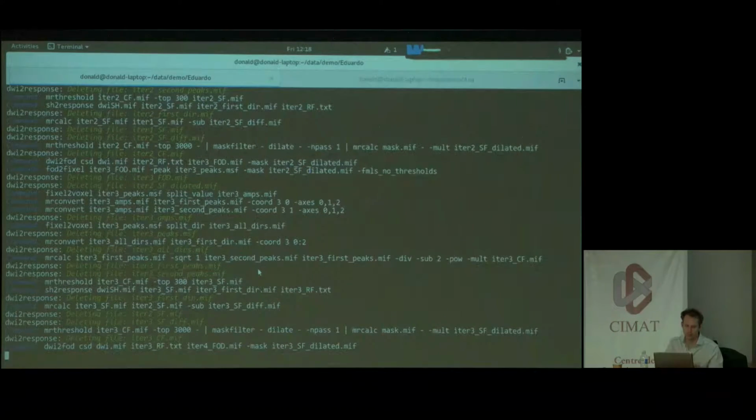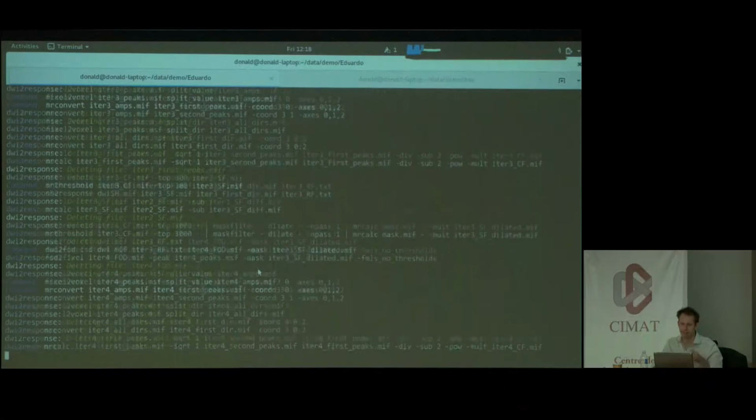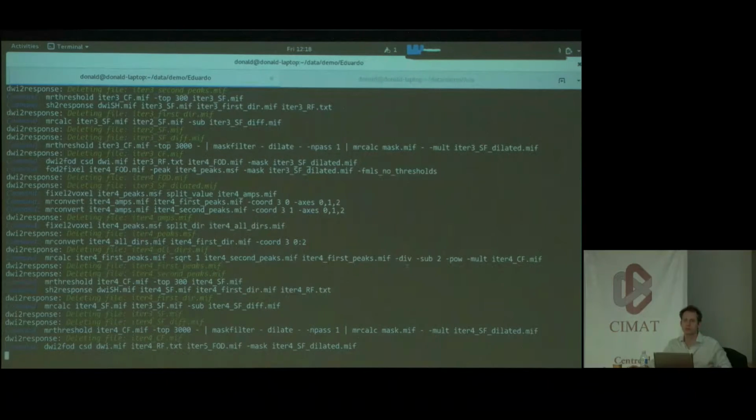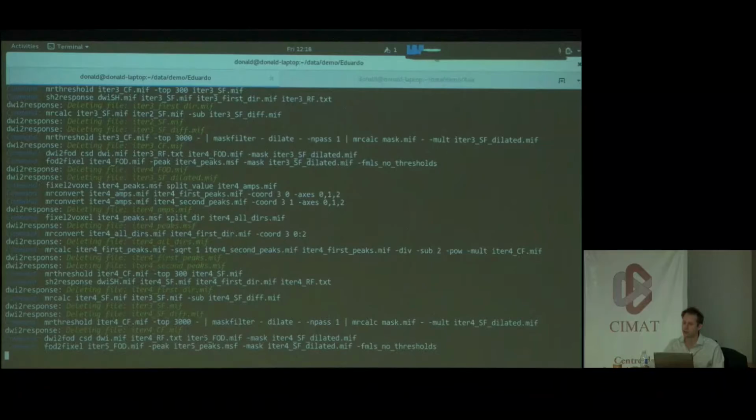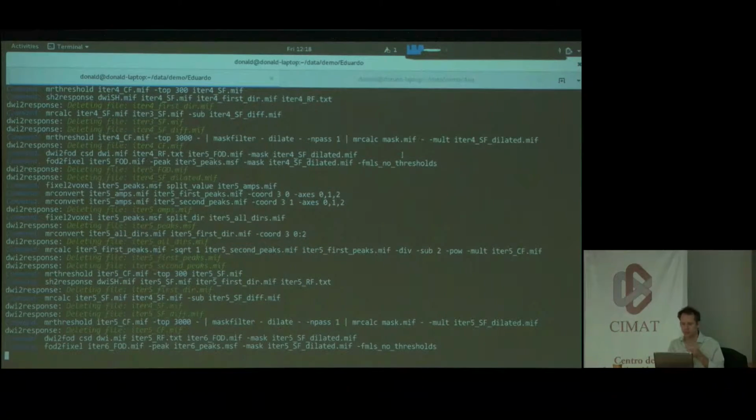This is zipping through it, that's fine. I'm not going to run anything more because that will probably kill my laptop. By the way, in terms of those people asking about the hardware requirements, this is my memory consumption, the dark green stuff. This is an 8 gig system, so it's not using a massive amount of RAM. CPU-wise, yes, it's going hell for leather, but that's a dual core, no hyper-threading, so it's just running 2 threads. I think any modern laptop would do better than that nowadays.